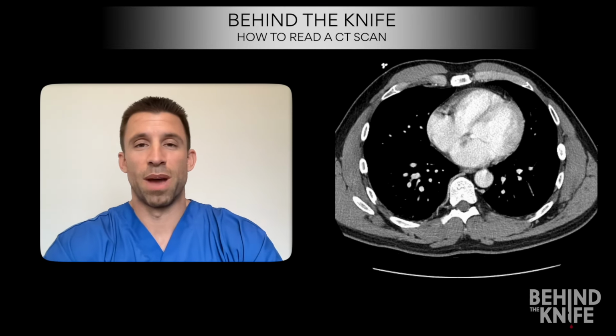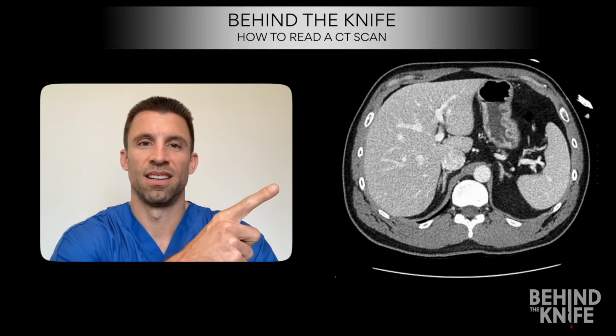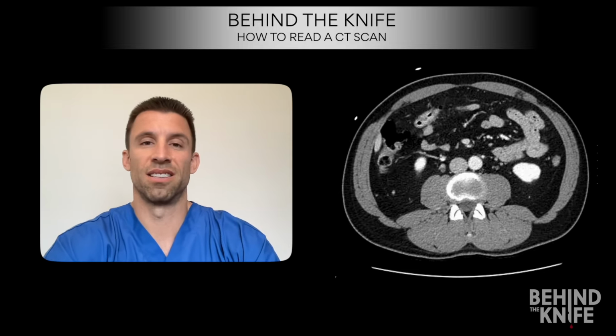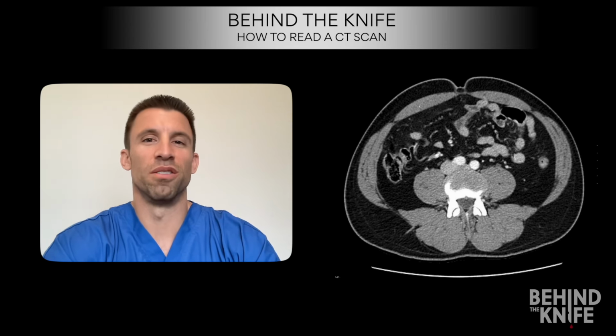Hello, friends. This is Patrick Georgioff, trauma and acute care surgeon at Duke University, and today we are talking CT scans. Now, on your surgery rotation, you will quickly learn that CT scans are the workhorse imaging modality for our patients. In fact, most surgeons really do love a good CT scan.